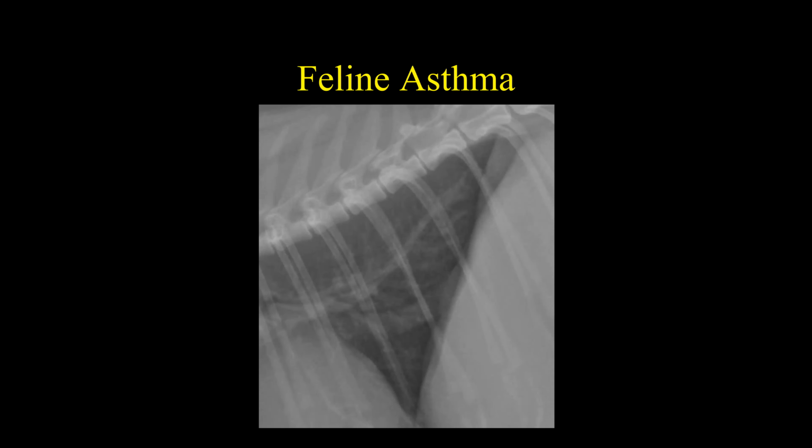But most of these cats that have feline asthma are going to be wheezing, coughing, and have increased lung sounds when you listen to their lungs with the stethoscope. So again, you always put the radiographs in clinical context with the dog. One of my mentors told me a long time ago, you always treat the dog and not the radiographs. Everything you see radiographically, put it in clinical context with what the dog's doing, and make it fit the history and the signalment to make a radiographic diagnosis.